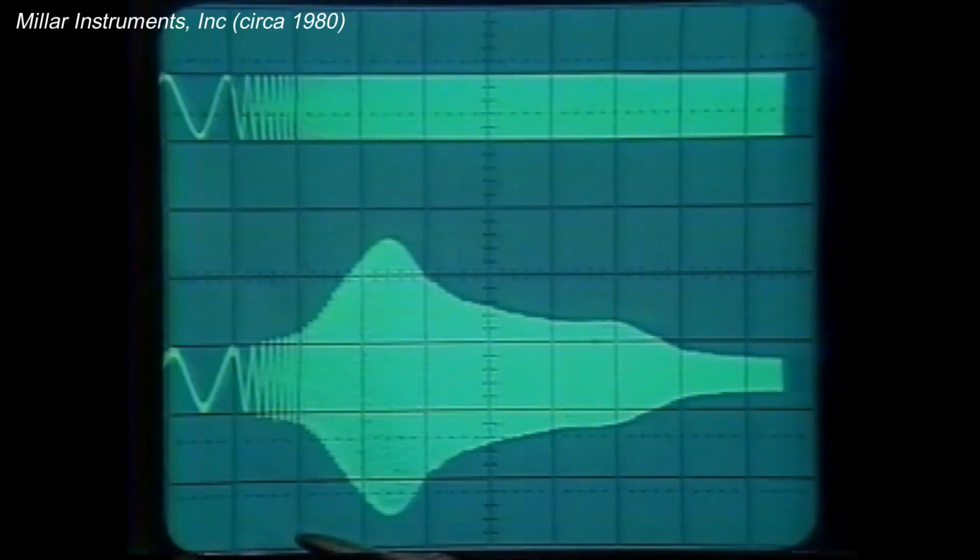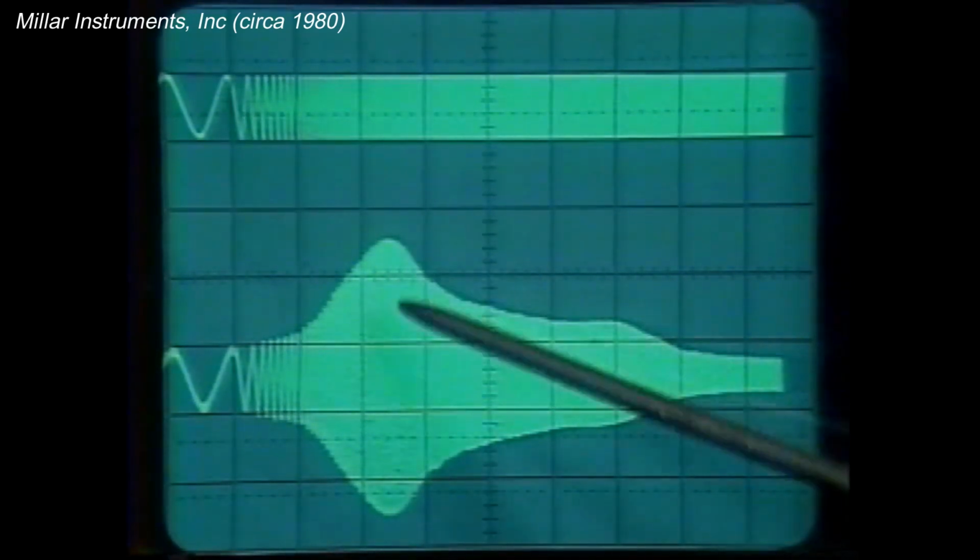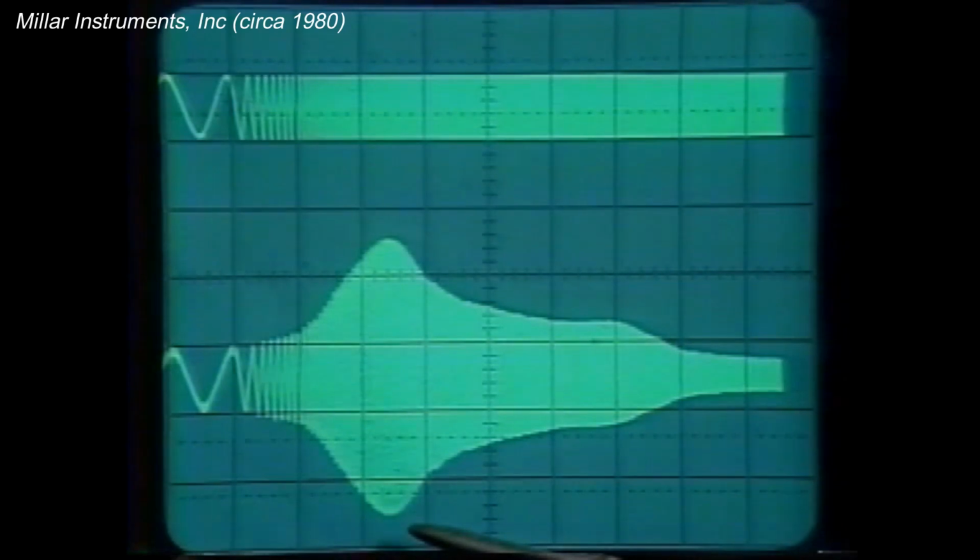Also, notice that eventually, at peak resonance, the amplitude is several times the original amplitude. This characteristic of fluid-filled catheters causes considerable distortion and inaccuracies in the pressures being recorded from the patient.